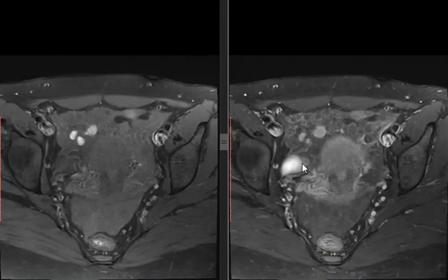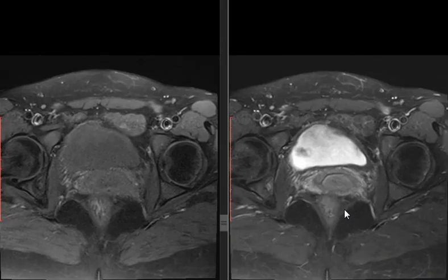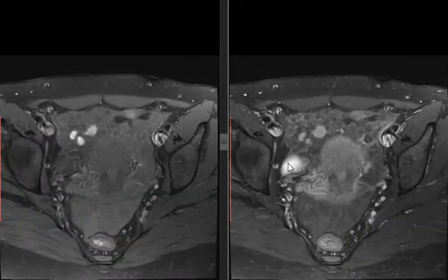Okay. And then there is mild peripheral enhancement of the mass, in the septa of the mass. Multilocated septa, bubbly appearance, or honeycomb appearance, also we can say that. Good. You can say that.